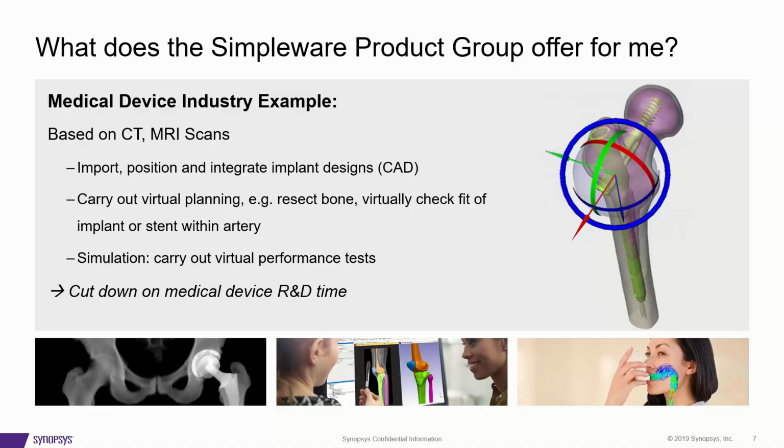Then different CAD models of different designs of implant can be imported into those structures. Everything can be meshed together and models can be produced for the simulation of those structures so that we can assess the performance of these implants, their positioning, their sizing, for instance, on the overall performance of the implant itself. So we can assess how well that procedure will have gone if the various different placements are used and the various different sizes are used, so that really the implant size perhaps or the positioning can be optimized for the best outcome.